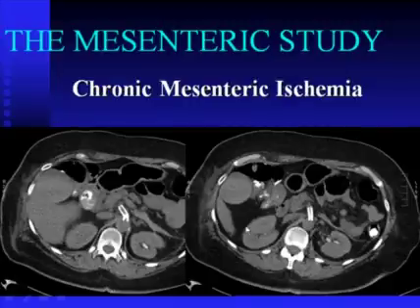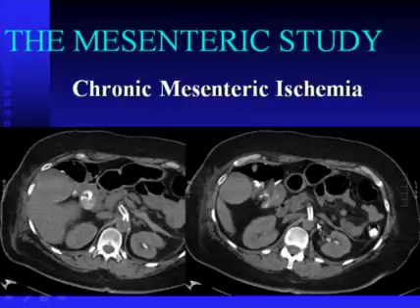So in considering that, this is a CT evaluation of the mesentery showing the celiac and superior mesenteric artery stents very clearly. These can also be followed post-stenting very easily with duplex ultrasound, as the stents are metallic structures. They show up very nicely on ultrasound, and it's a very simple, straightforward study to do that follow-up.